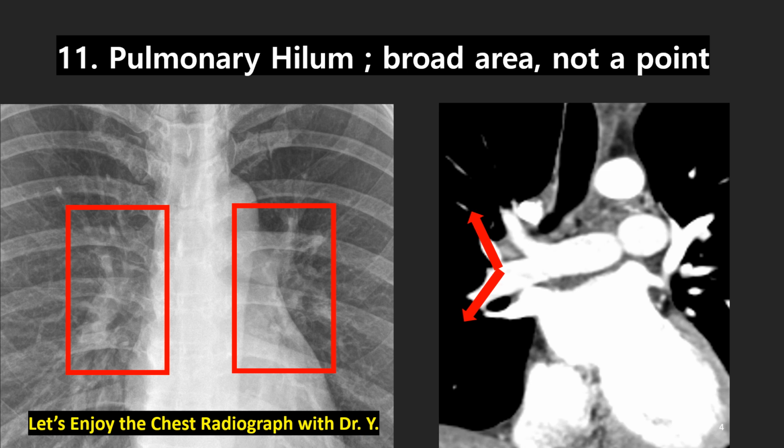Let's start our new session, pulmonary hilum. Hilum is actually a broad area, not a point. This is hilum. Hila area, in fact area. Hila area. But we call this as hilum.